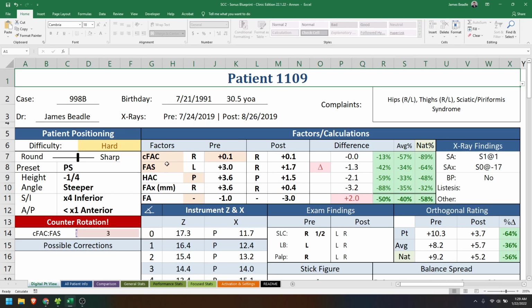Then, more importantly, is this one in this column. This is new, and what it means is that if it highlights, you are doing worse than the rest of the community. That's important because now you know, I need to really focus on what my table positionings are that will affect those factors.